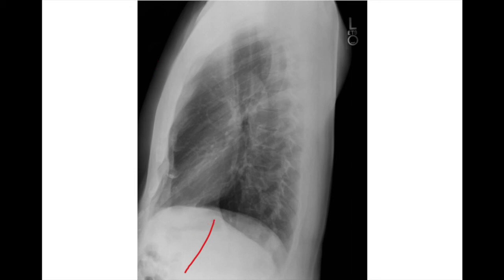In regards to the cardiac silhouette, more so you're looking in the retrocardiac area at the edge of the heart if there's a retrocardiac opacity. The diaphragms here appear to be equal, but the concavity of the diaphragms tends to lead to this within the lateral view. Gastric bubble you could see anteriorly, but does not extend obviously posteriorly on this film. So this is a normal lateral chest X-ray.